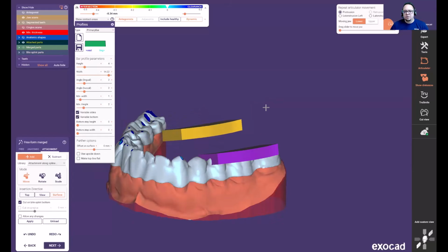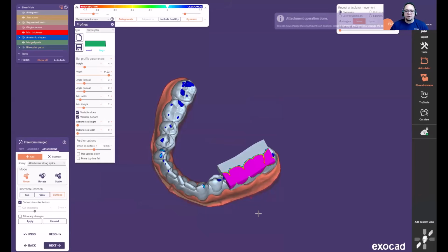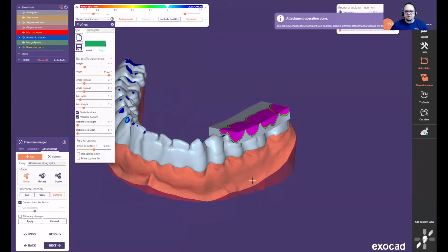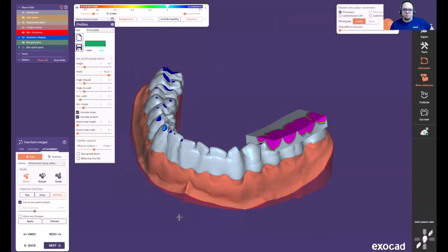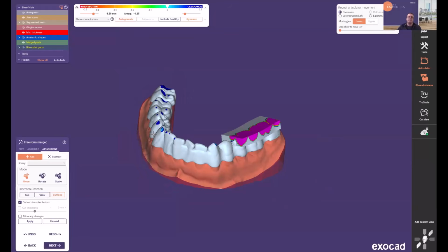So that's one method that I've seen useful. I would try that out. That's something I found kind of helpful in certain cases, but the flatten tool in the wizard workflow, like I said, if you utilize that, opening your bite after the fact of generating your flat plane, you'll probably get more controlled results. Yeah, that's a good tip.